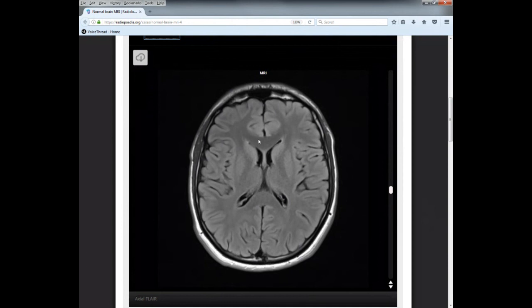If you look at the genu and then you look on each hemisphere, just posterior to that, right here is your caudate nucleus. Okay, that's one of your islands of gray matter located deep within the cortex. There's going to be a canal, if you will, of white matter separating the caudate nucleus from the lentiform nucleus.